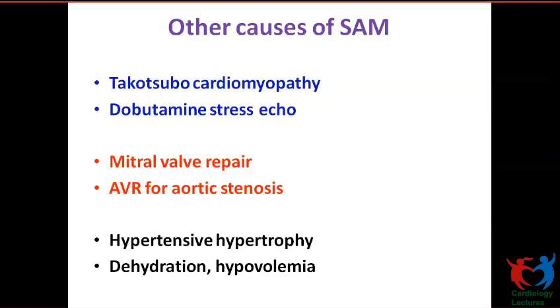Mitral valve prolapse, pericardial effusion, hypercontractile states. So here, because the LV is hypercontractile, the mitral valve moves and the maximum movement coincides with the peak posterior wall motion. Whereas true SAM occurs before that. Pseudo SAM coincides with the peak of posterior wall movement.